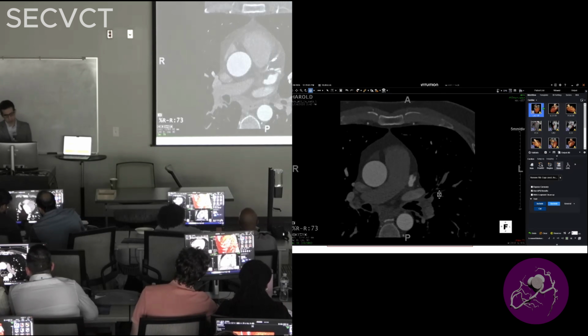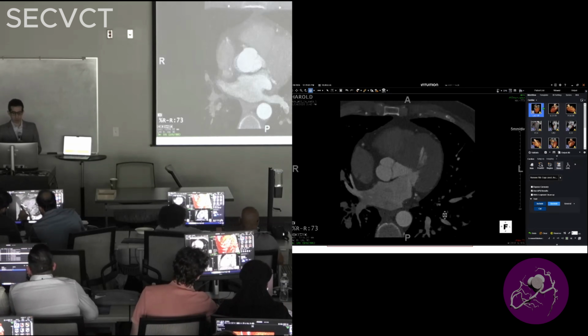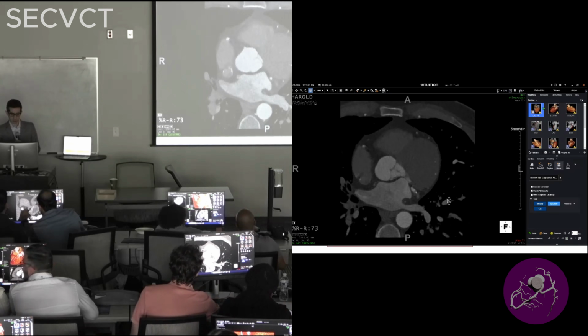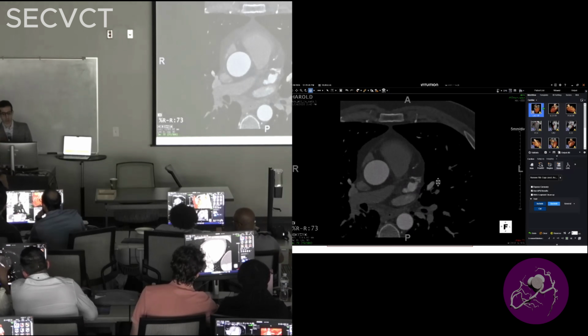Again, this patient, I'm just gonna go through it quickly. I'm looking at the extracardiac things quickly, the veins, pulmonary veins, small diverticulum of the left atrium. All right, so let's look at the LAD together.